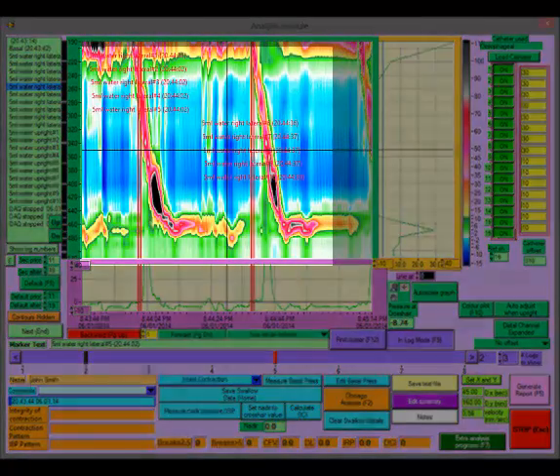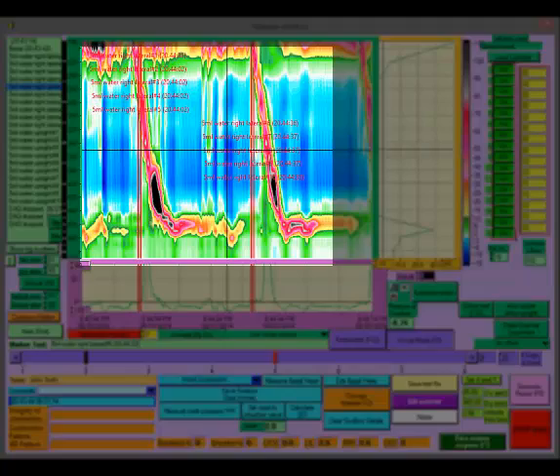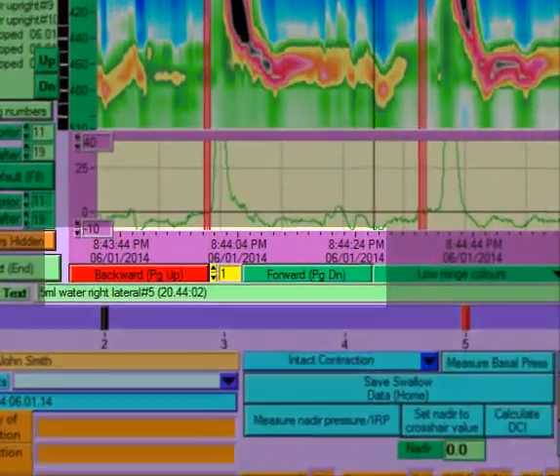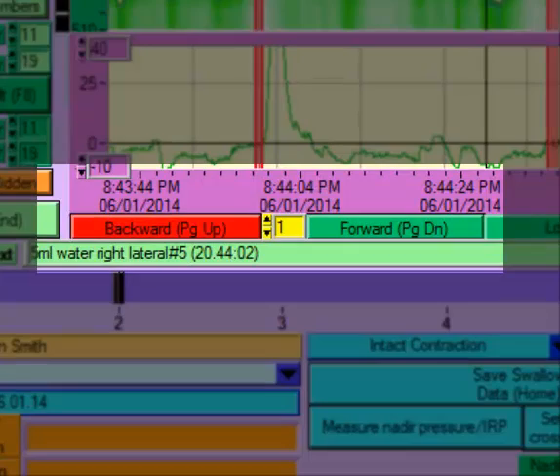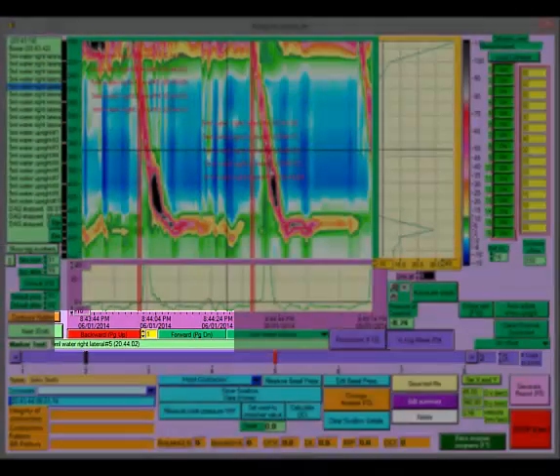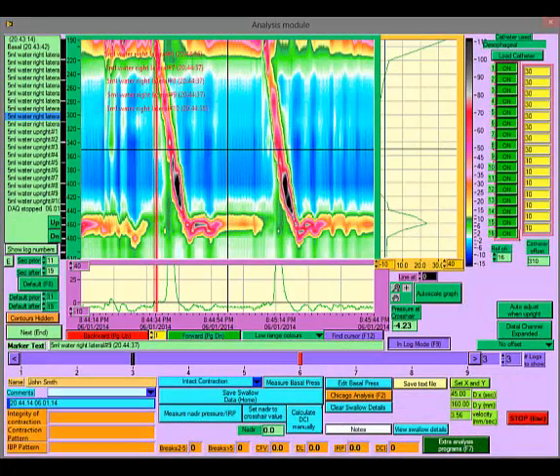In data log mode, all markers within the period loaded are displayed on the colour plot. Another way to move backwards or forwards in either the marker mode or the data log mode is to use the buttons marked backward or forward above the timeline. In data log mode, this will move you by the number of data logs displayed between the forward and backward buttons. To return to marker mode, click on a marker.